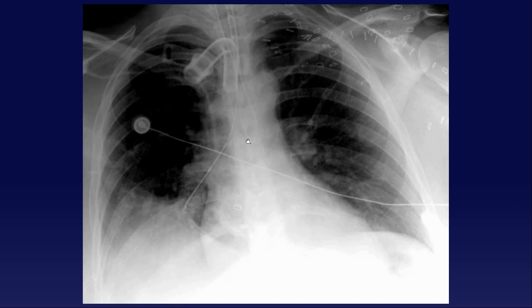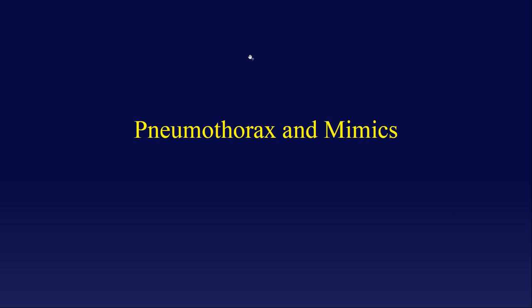Oh, by the way, for these NG tubes, when they start doing things like that, I honestly don't even recommend repositioning. Just pull the darn thing out. If its tip is here, you can advance it and you should be okay, right? But when you have something doing multiple loops in the esophagus, just pull it out and start from scratch, okay? Repositioning with something that's this badly mucked up isn't going to help very much, probably, okay?